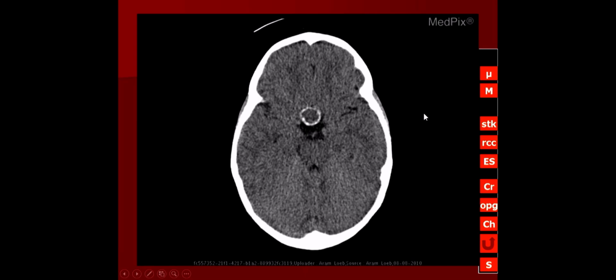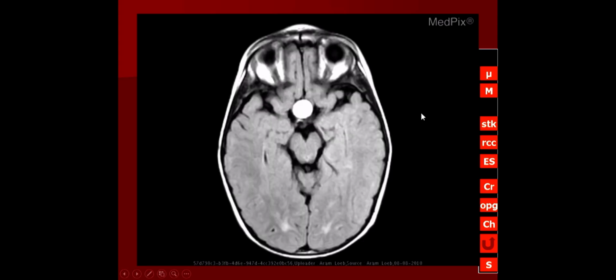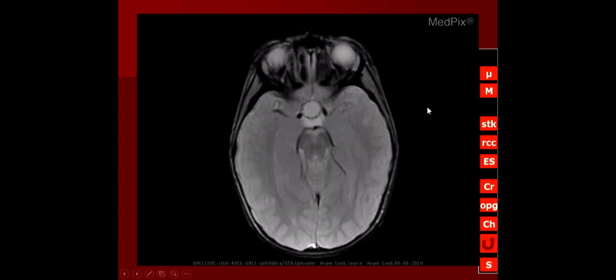So anyway, here's the CT that was done first. Classic appearance, rounded lesion, suprasellar cistern, peripheral rim of calcification. That oily, wet keratin causes T1 shortening, so the lesion can be bright on the T1 weighted image. Sometimes they are more solid and less cystic, but this one is a classic in that it's primarily a cystic lesion.